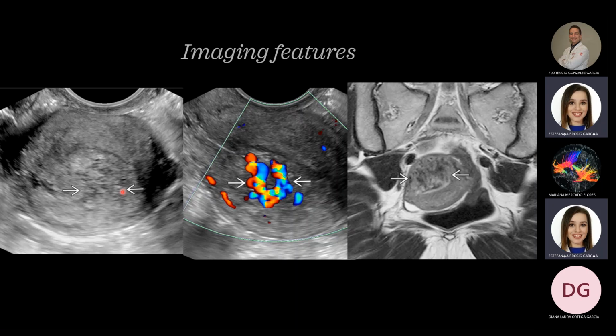We have another image, which characterizes this disease. Transvaginal ultrasound shows an ill-defined area of small anechoic spaces within the myometrium, producing a spongy myometrial echo texture. And then sagittal transvaginal ultrasound with color Doppler in the same patient shows marked vascular flow within the myometrium, corresponding to the spongy myometrium in the grayscale, classic features of uterine arteriovenous malformation.